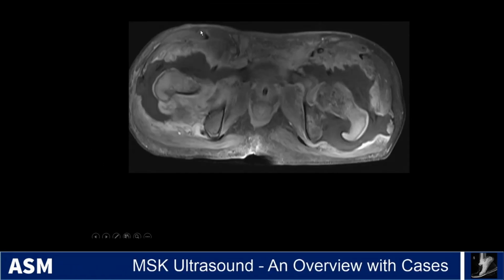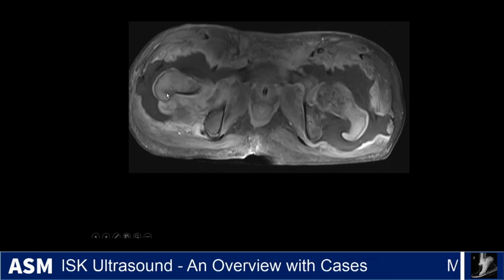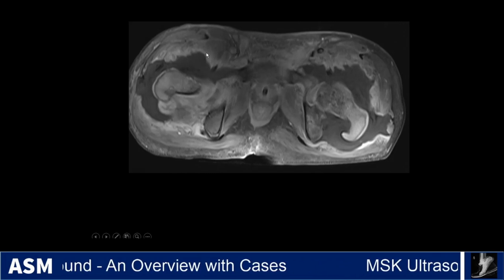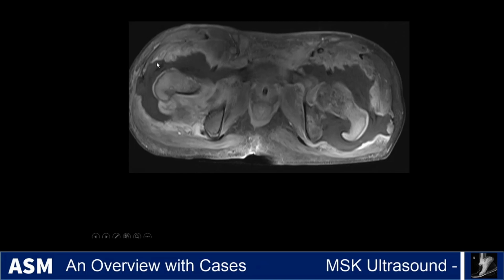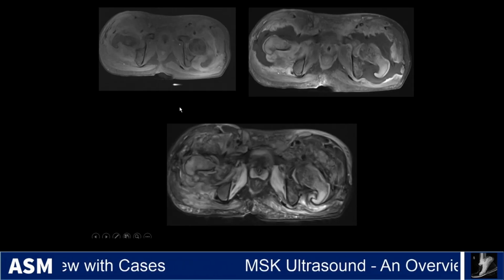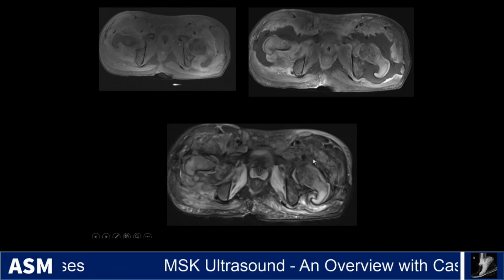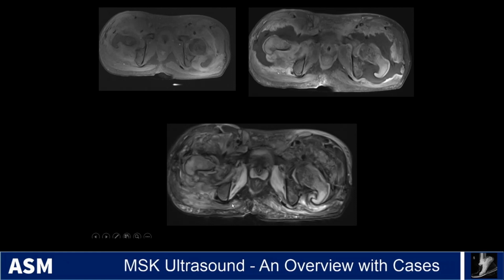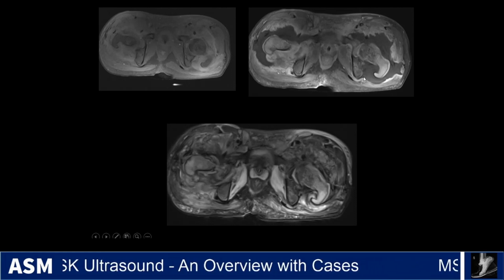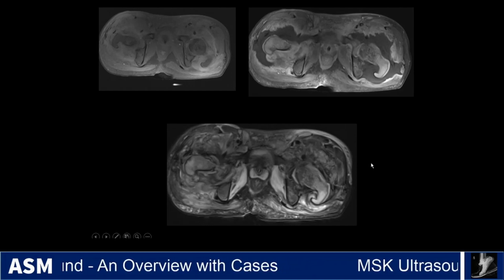This was an interesting case. This patient was a paraplegic who did not have any open wounds at the time, but had this MRI. There was swelling, there was concern for infection. Post-contrast T1 showing this large area of non-enhancement around the pelvis with rim enhancement here. And the corresponding fluid-sensitive pulse sequence in these areas, not really showing simple fluid anywhere. But nevertheless, this was interpreted as infection, can't exclude osteomyelitis and septic arthritis, and so an aspiration was requested.